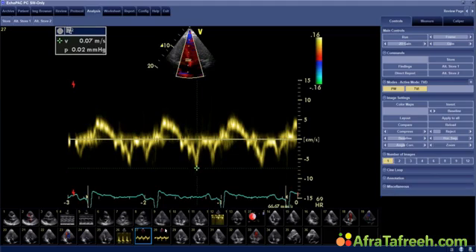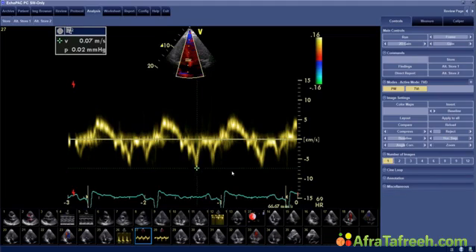So what does this illustrate? It just shows us that truly the patient must have dyspnea due to left ventricular dysfunction. So a very nice thing that you can always use, diastolic function can always be used to look at how the patient is really feeling and how he's doing.